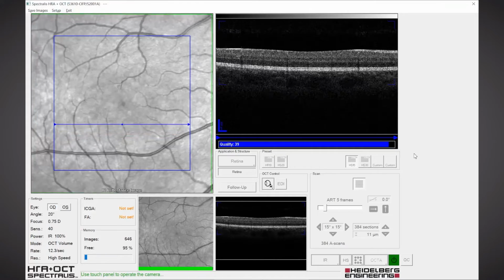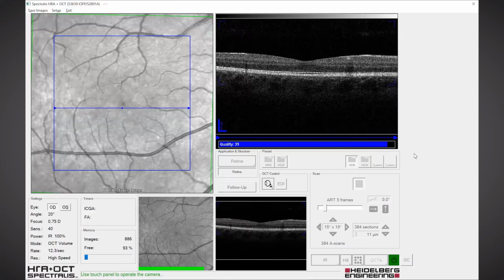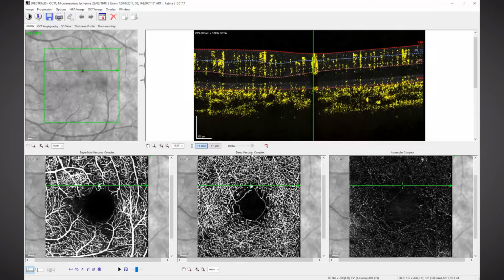And you also need to be able to hold position on that capillary. So we have TrueTrack, live eye tracking to allow us to move with the eye and stay on that capillary. And thirdly, we need to measure the flow of the red blood cells through the capillary, bearing in mind that the flow is inconsistent. Sometimes it's fast, sometimes it's slow, and it varies throughout the day. So sampling becomes very important.